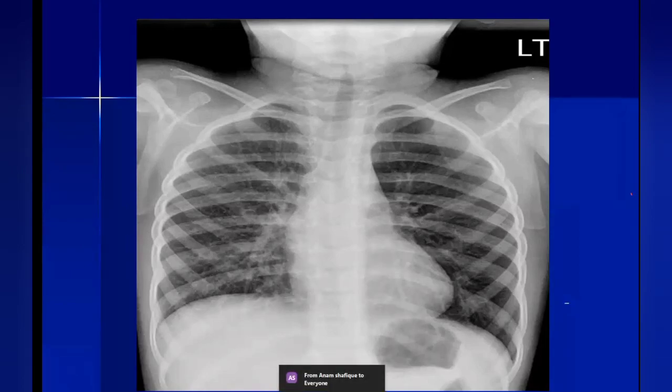So on which side? The abnormal side will be down, and the normal side will be up. So usually you put the patient on the abnormal side. So if it didn't change, that means what? Presence of a one-way valve.